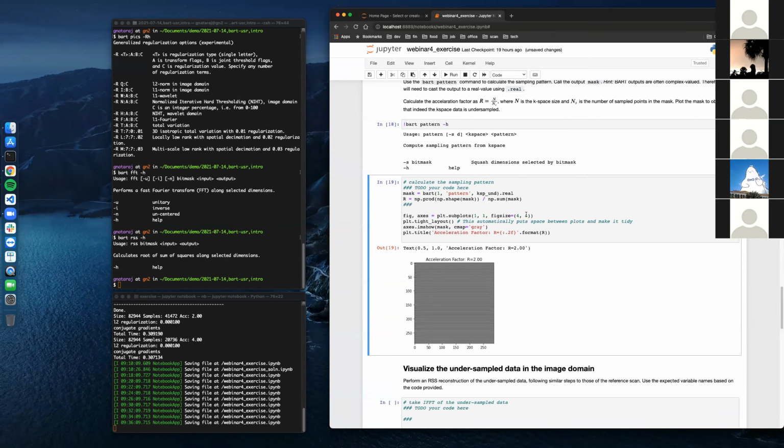Would taking the mean of that mask also work? Inverse, maybe. We need to calculate the number of elements. If half the samples in the mask are 1, the mean would be 0.5, so it'd be the inverse of the mean, right? That would give the same result. That's true. Yes, it would be the inverse. We could have calculated it by the inverse of the mean. Thank you, that's a cleaner solution, actually.